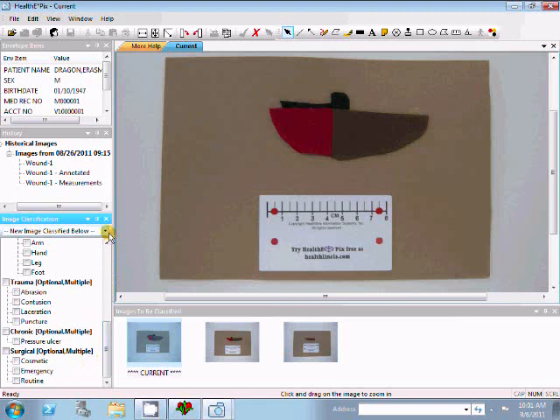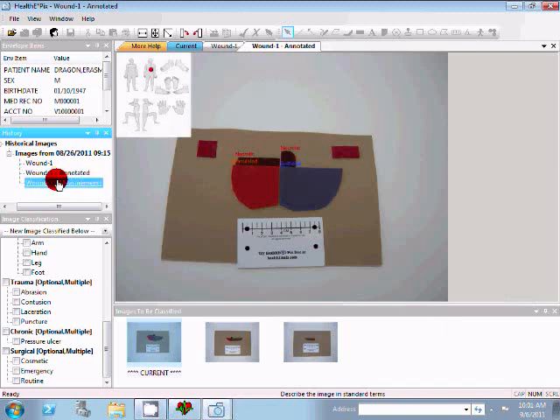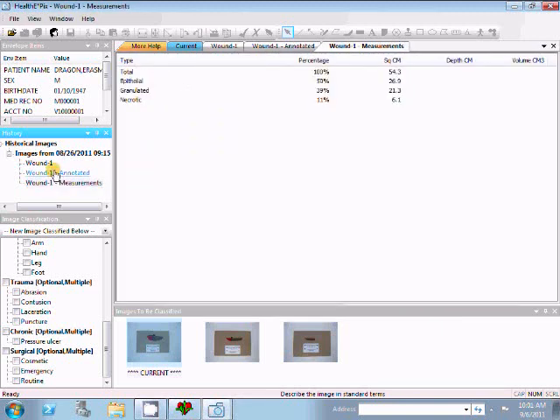In addition to the checkboxes, there's a drop list that allows you to indicate that the image is the same as one that has already been classified. For example, if I click in the history pane, I can view images for this patient from past visits. We always maintain the original picture along with any annotations to the pictures. In addition, you'll note that there are measurements from previous images. I'll cover annotations and measurements in a bit.